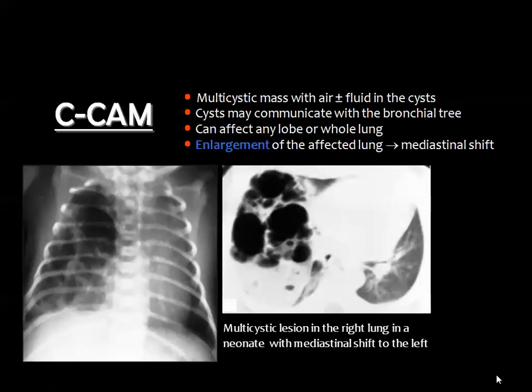Then the CT scan confirmed the presence of thick wall air-filled cavities compressing the remaining part of the lung and displacing the heart to the opposite side. You should remember that this is a congenital disease and it is diagnosed even in utero, and this is completely different from the issue I have discussed before, which is known as cavitary necrosis complicating pneumonia.